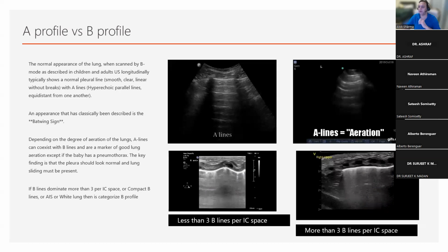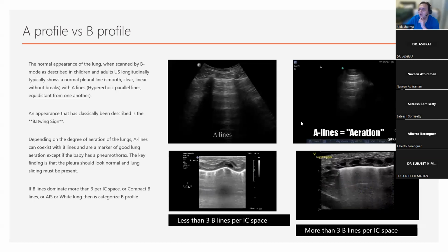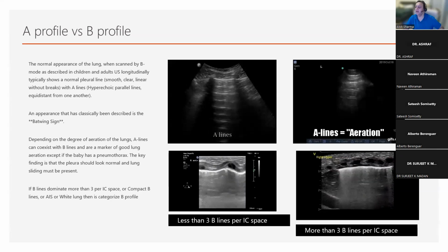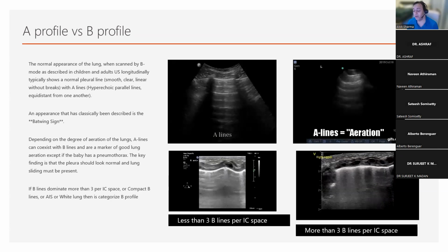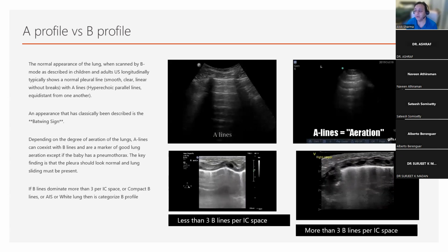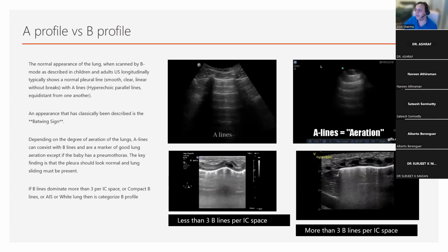And this is quite important in that when you look at lung aeration, unfortunately for us, babies show transition. That means you could have a baby who starts in its mother's womb without any aeration, where all the oxygen and carbon dioxide is being managed through the placenta. For that baby, you're not going to get an A profile because his lungs are full of fluid.